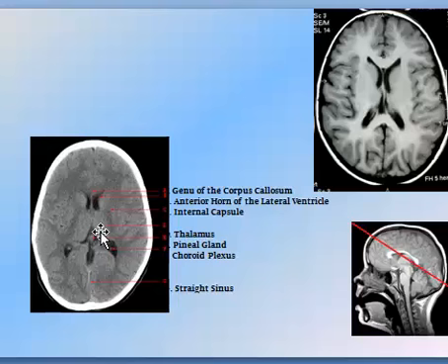Remember the thalamus. So between the thalamus and lentiform is the posterior limb. Between the caudate and lentiform is the anterior limb, and there is a genu of the internal capsule. Then you have to know the pineal body, pineal gland, at the posterior part of the third ventricle. You have to know the choroid plexus, the cerebral veins lying in the cistern for the vein of Galen. Of course, this one is the straight sinus.